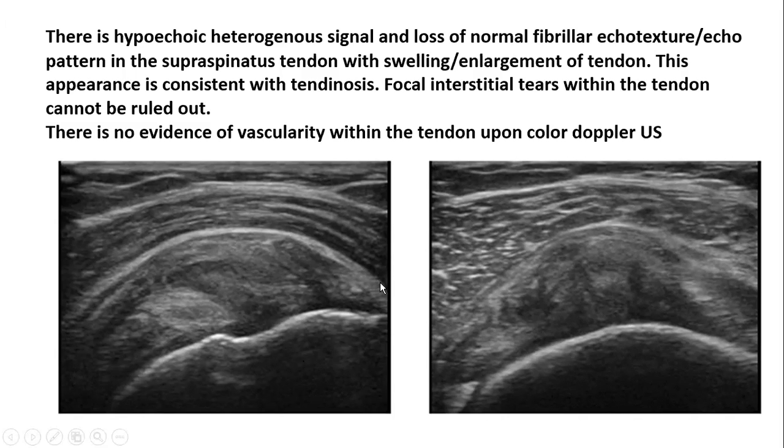Yeah, so here, remember that image I told you, this area was more flat, not so rounded. Yes. Right. So think of it as different interfaces. Going from skin to deep to bone: this is skin, subcutaneous tissue, deltoid, bursa, tendon, and bone, right?